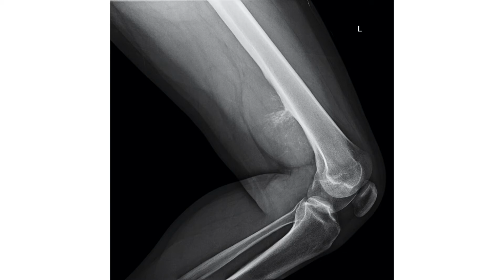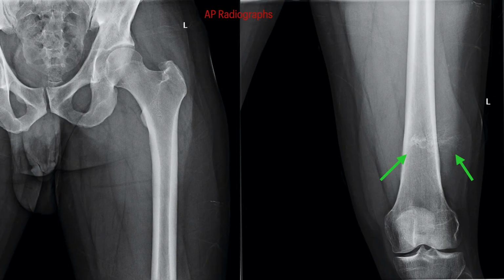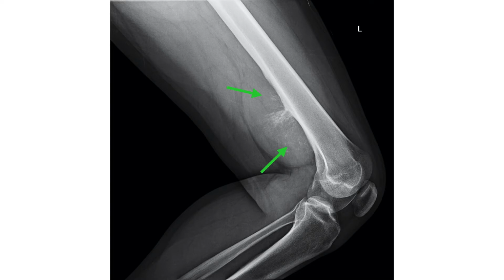So this kind of helps us in our differential here. Here's the arrows kind of showing you guys what we're talking about here if you couldn't see my cursor there. We know this is osteoid matrix. We have a stalk within it, so we need to come up with a differential here. Heterotopic ossification could be within your differential. The thing about heterotopic ossification, though, is that it typically ossifies from outside in, whereas this looks like it's going from inside out. So this looks more like it's probably a tumor of some sort.